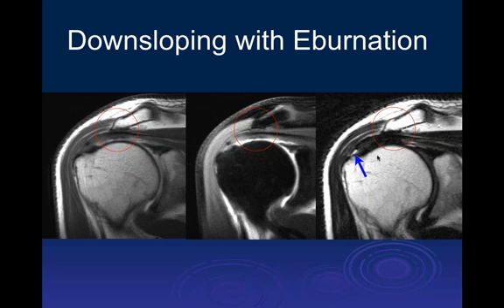The joint side surface. Yeah. So as you get older, then it's either side, and most tears as you get older are actually interstitial. Okay. The way I understand it from the latest orthopedic literature. Good. Thank you.